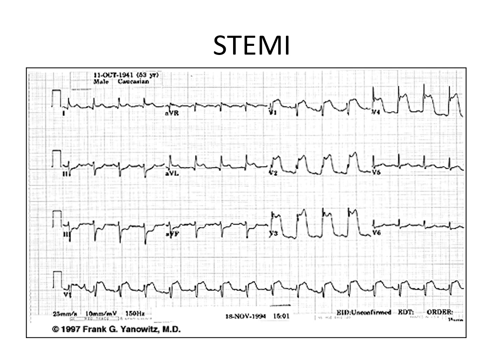We can also look at the lateral leads, so leads 1 and aVL, they have significant ST elevations as well. Well, what is the mirror image of the lateral leads? It is the inferior leads. So in leads 2, 3, and aVF, you see significant ST depressions mirroring the ST elevations laterally.